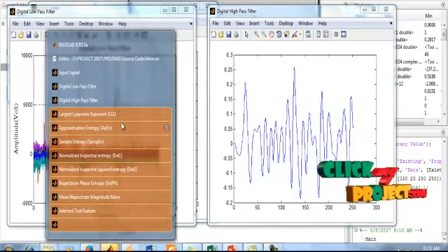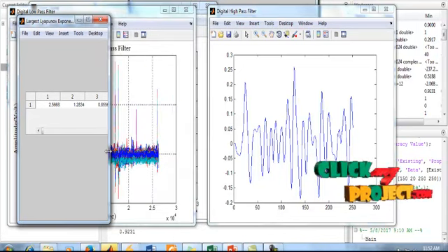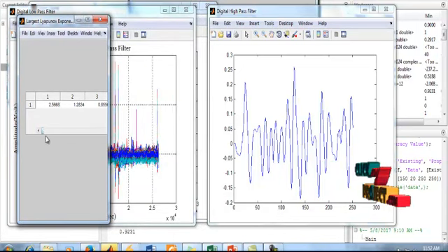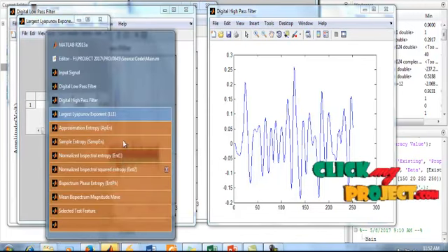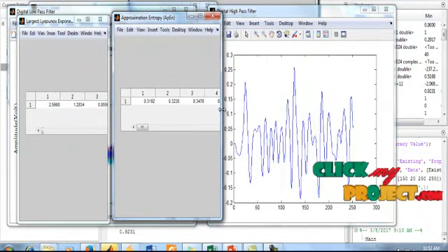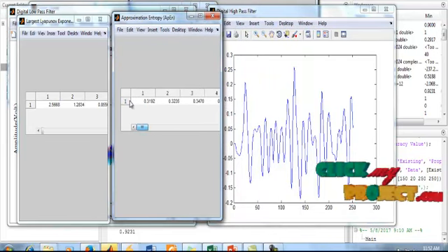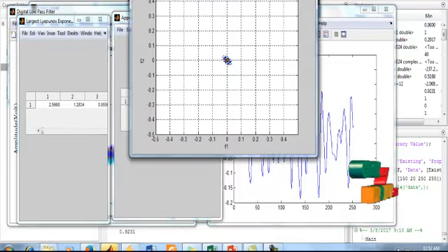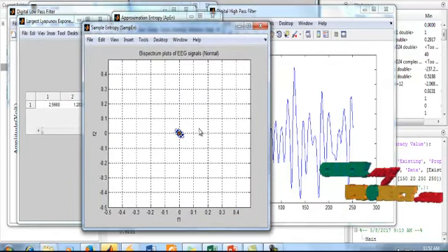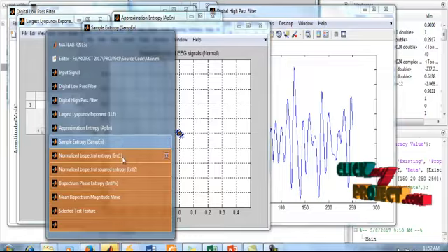After the pre-processing step, the feature extraction is carried out. Here the first LLE feature is extracted and then the values are plotted in the tabulation. Then the approximate entropy, that is the ApEn value, is extracted from the signal and those values are plotted in the tabulation. There are nearly hundreds of features. After that, the sample entropy features are extracted and those values are plotted in graph format, hence this feature is well optimized and plotted in graph format.